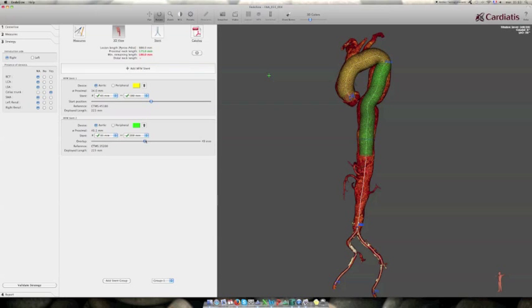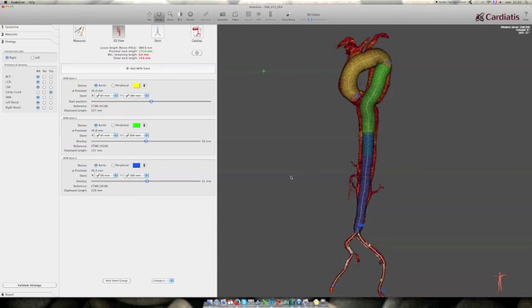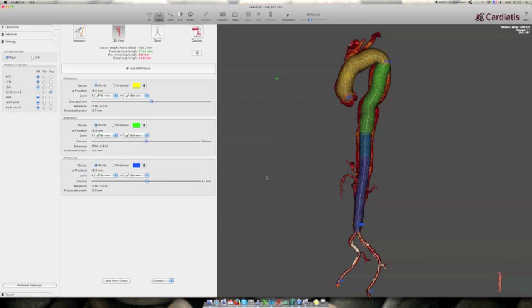After the selection, in this case, we can select the third MFM to cover the full aortic aneurysm, always in a smaller size. The real implantation should occur from the distal part to the proximal part, so we can do it in a telescopic fashion, by introducing the larger MFM inside the smaller MFM.